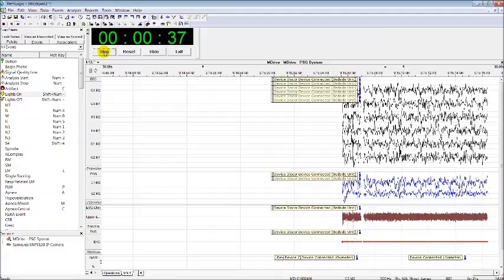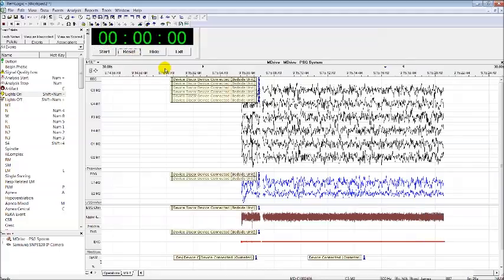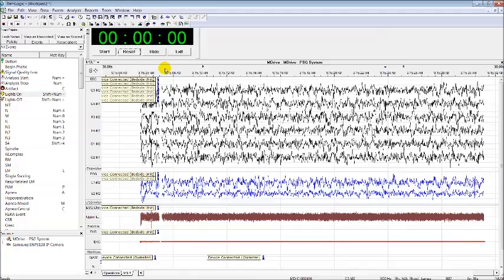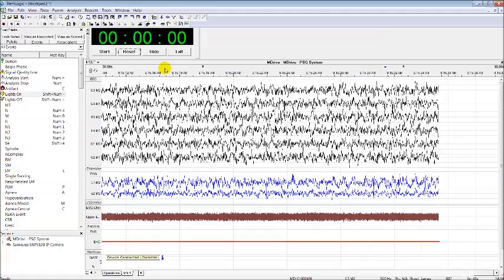Okay, we are back on. So I'll just stop the timer and reset it. The same steps again: we will do the patient biocalibration, followed by the standardized instructions for patients, and then lights off, and then you can start to go into the scoring mode again.